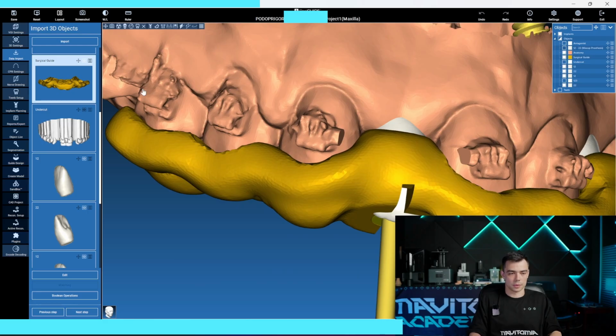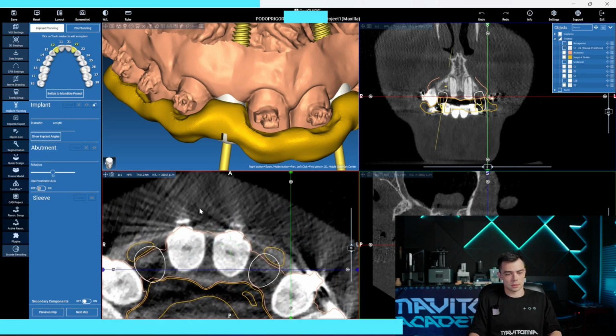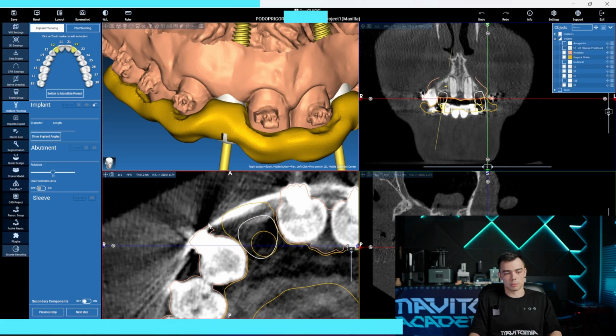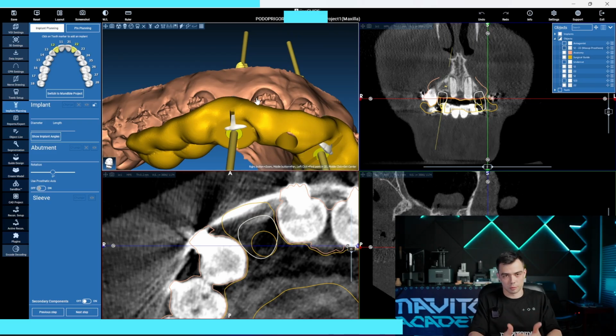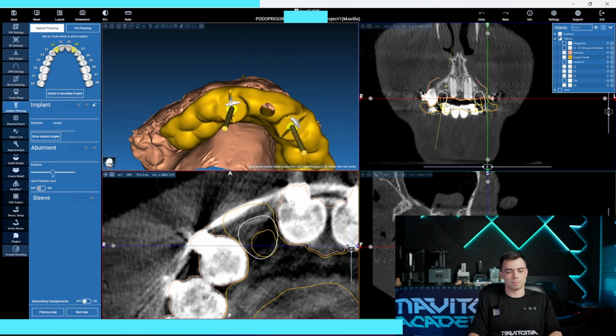And also there is, in Russian it's called a chain between braces, but what I mean here is that you see the metal part between braces here, and it must be taken off, of course, during the operation, only during the operation with the surgical guide, because if you try to place your guide on this chain, your guide firstly will be weak, secondly probably you will face difficulties with the fitting, because this metal chain, which is shown only on CBCT here, most probably will not be fully scanned.